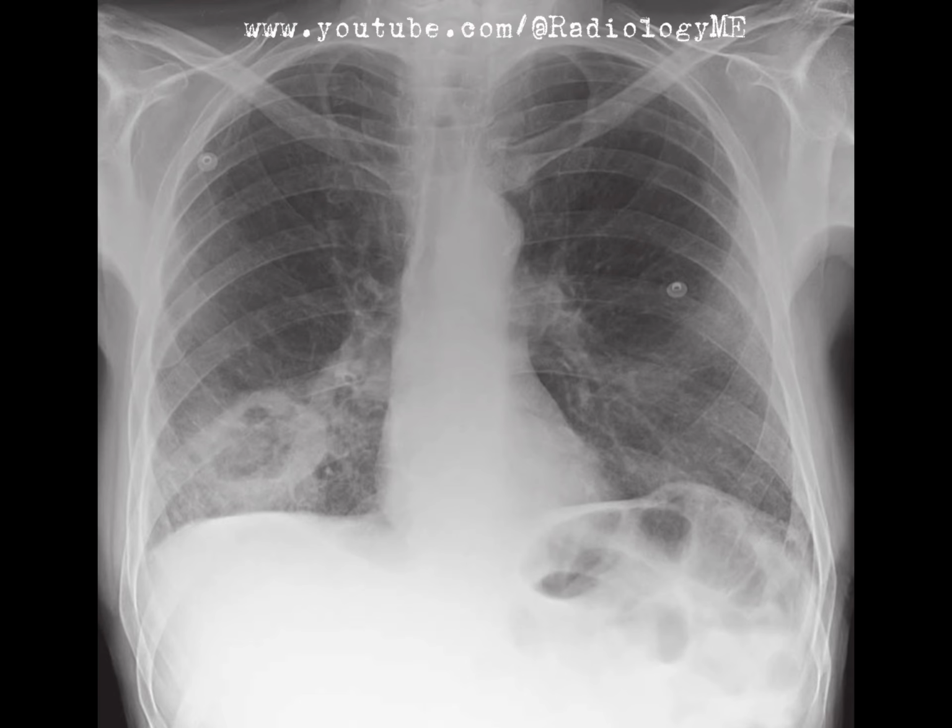For this frontal chest radiograph, we have a skeletally mature patient with a large, well-defined opacity in the right lower zone. The lesion has a thick wall with clear evidence of central cavitation. The internal margins are irregular, and there's an impression of an air fluid level within the cavity, which raises a few important considerations.